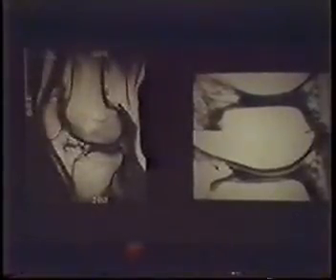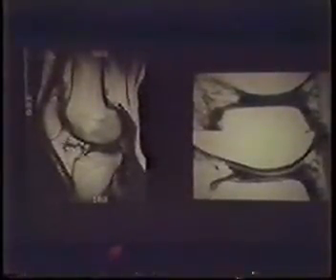You see the signal on the high field just due to the higher field strength and better resolution, better signal. I think it's primarily due to the increased signal to noise that you have in a high field system. Maybe we could talk about that later if you would like. It would take a while to go into that at the present time. Maybe we can talk about it afterwards.